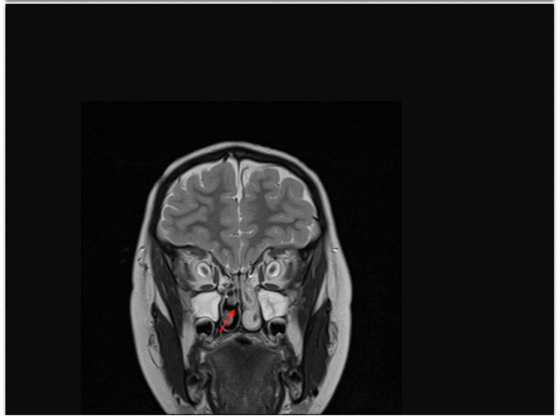The nasal cavity contains air on the right, and on the left, the more congested mucosa displaces air from the nasal cavity. On the left side, swollen mucosa in the nasal cavity displaces air. Maxillary sinus, watery mucosal thickening, has bright signal on this T2 weighted image.